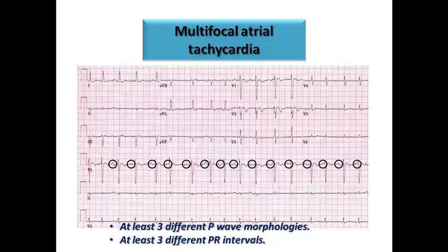Multifocal means that there are multiple foci for this rhythm. Atrial stands for the atrium being the origin, as all the foci are in the atrium, and this explains why all the complexes show normal morphology and axis. And tachycardia because the heart rate here is above 100.